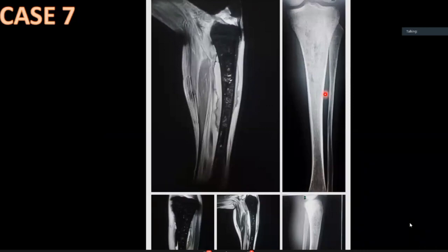Soft density, but the amazing or striking thing here on MRI is the density or signal intensity of the long bone. This is not usual. This is very dark or hypointense bone.